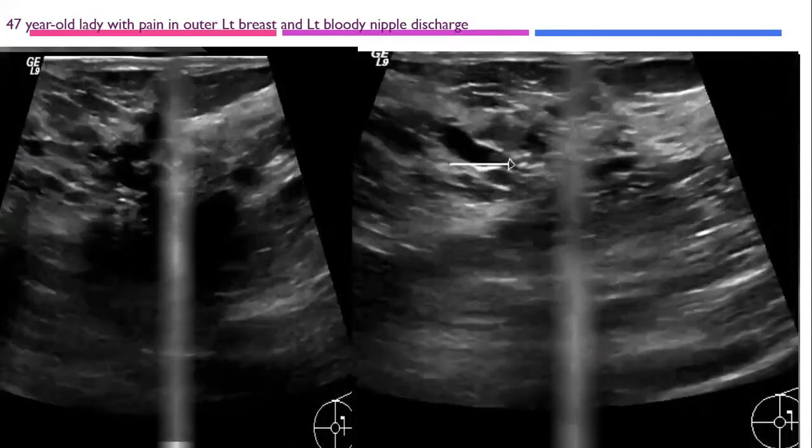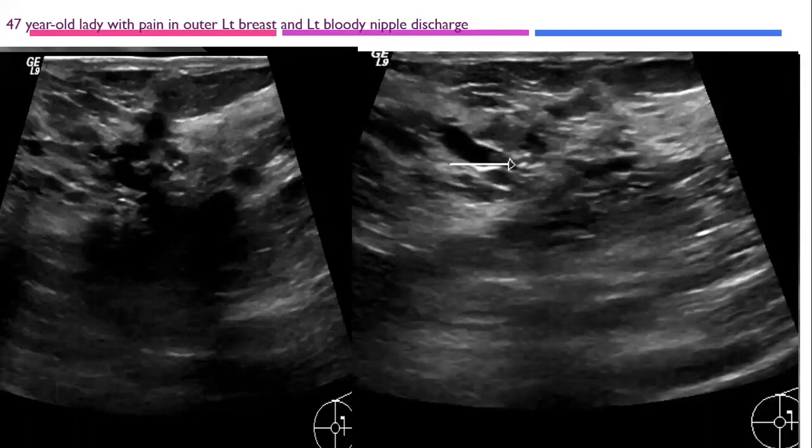Then we had done an ultrasound for her that revealed segmental ductasia, where some of the ducts are hypoechoic and others are echo-free. The ductal microcalcification could also be appreciated on ultrasound. The findings are also suspicious for DCIS because of hypoechogenicity and presence of calcifications.